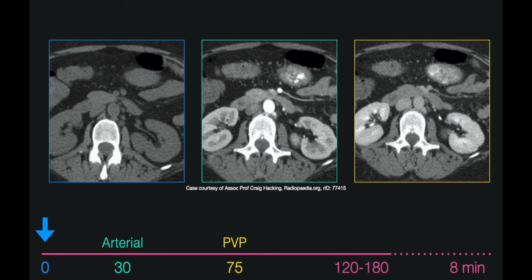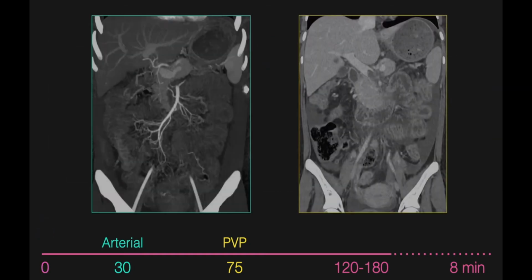The essential sequences here are a non-contrast CT, which allows you to dismiss any dense material in the GI tract after contrast is given, arterial and portal venous phases, which are done to provide 2 time points after giving contrast that allow you to see contrast entering the lumen and dispersing over time. Here in this example, contrast enters the transverse colon during arterial phase and disperses in the portal venous phase, confirming that is the location of active bleeding, which will help guide embolization therapy.